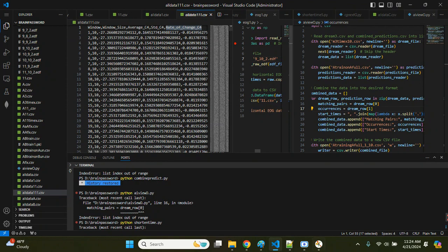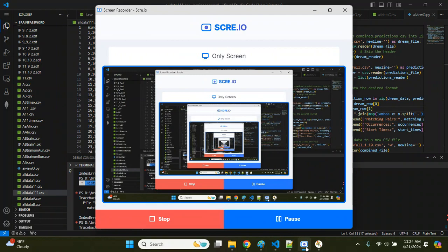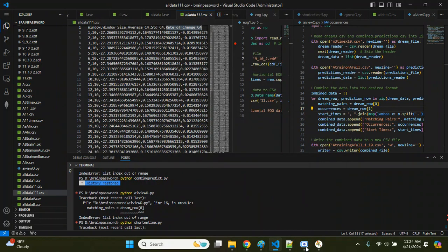Like I said, I think, let's see, is it still recording? Oh, it's still recording. I'm not going to stop it. We got a little memory on the computer. But that's the visualization for that.